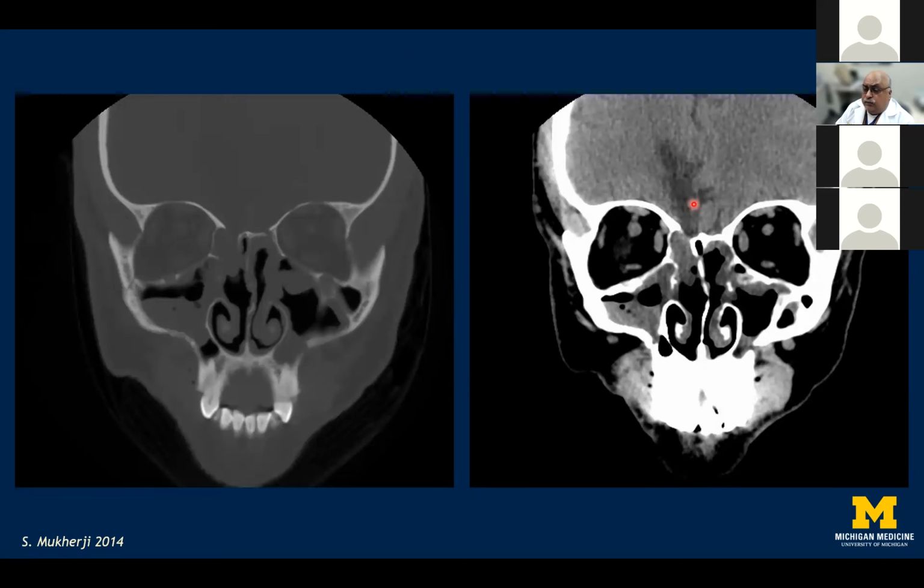Moreover, some instances would be helpful to make a diagnosis in the acute phase itself, where we can see that there is this patient who came with a history of trauma in the remote past, and the patient then had CSF rhinorrhea. And once we can see for ourselves that on the CT, on the bone and soft tissue windows, there is this area of encephalomalacia of the frontal lobe, and also some soft tissue material which is non-dependent protruding through the defect, possibly representing a traumatic encephalocele.